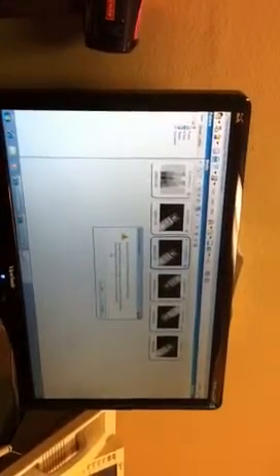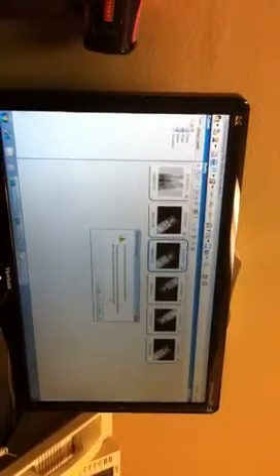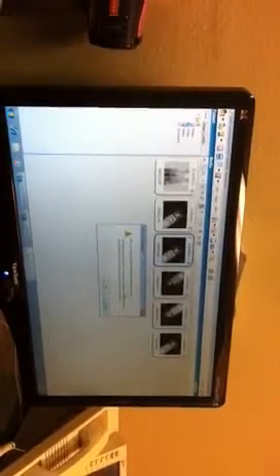Let's say you wanted to get rid of one of these images. If you clicked on the garbage can, it says, are you sure you want to delete the selected media? The media will no longer be accessible from this patient, but they will be archived should future recovery be required. So you're not actually deleting it permanently. It's deleting it from the view. If you ever needed it, let's say you say, oops, a week from now, you can call us and say, patient so-and-so, we deleted an image, and we need that back. You can't get it back, but we can log in and get it out of the database. So once I click OK, it's going to disappear from here, but it's always in the database.